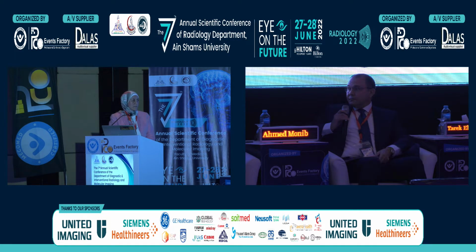الفانكشنال إيميجينج في الفيرادز هي اللي ليها الأبر هاند عن المورفولوجيك إيميجينج، يعني الديفيوجن والدي سي اي ليهم الأبر هاند compared to the signal category اللي هي التي 2 ويتد إيمجز. فاللي بنشوفه في الديفيوجن والدي سي اي هيجب اللي احنا شايفينه في التي 2.